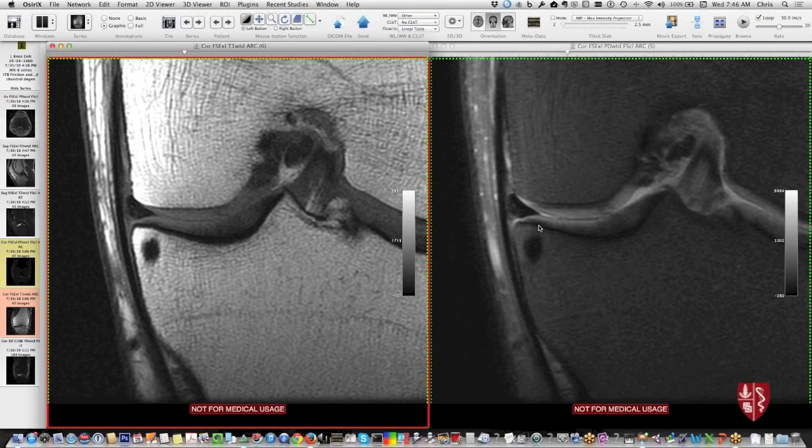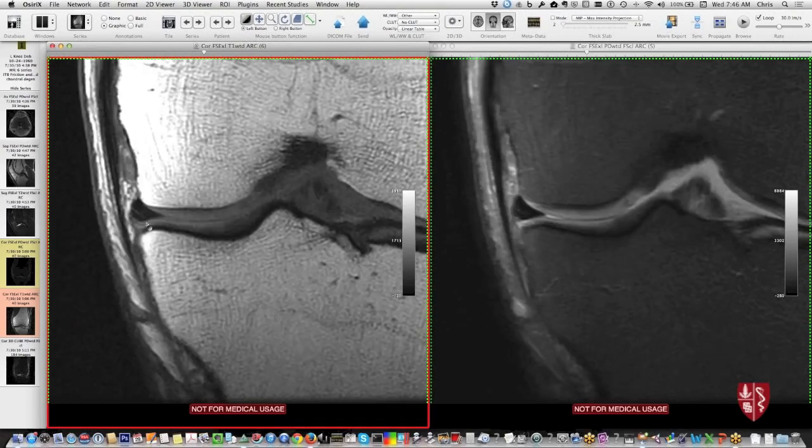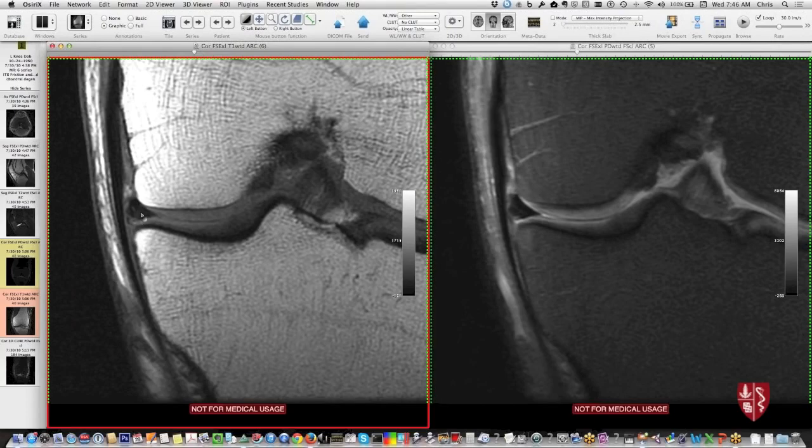images. So looking at the menisci, they should be nice triangular structures that have a sharp edge, and you can have little dots of internal signal in them, but the criteria for a tear is when that signal reaches the articular surface. And remember, the articular surface is the surfaces that go up against the cartilage, like along here or here. It's not the base. So the base would be the peripheral part of the meniscus, and that can have signal that goes out to the base, and that doesn't qualify as a tear, okay?